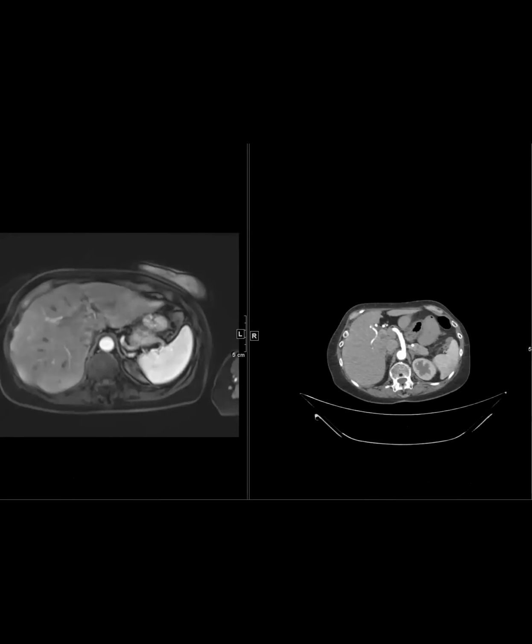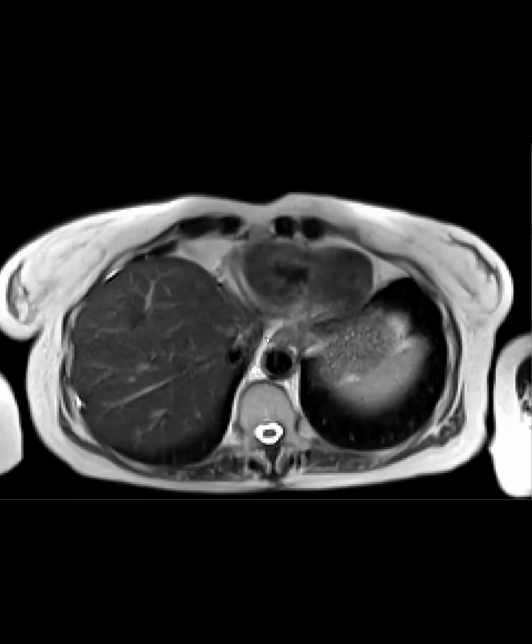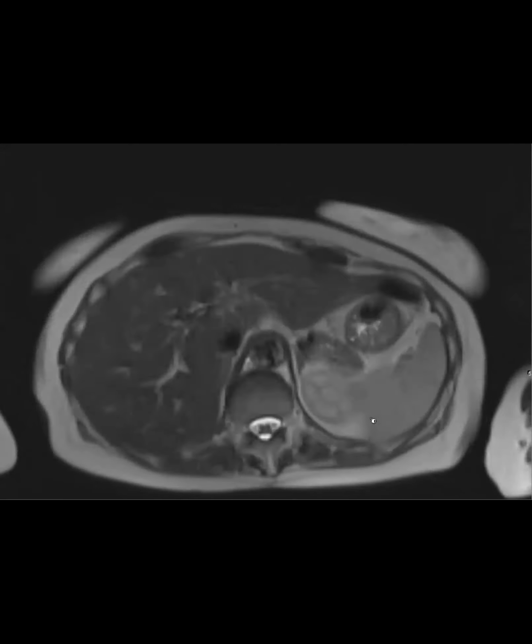Let me see how the stomach looked on the MR. And yeah, so in this patient, they very much clinically had an insulinoma. And then I think here, this is all normal rugae, just collapsed.